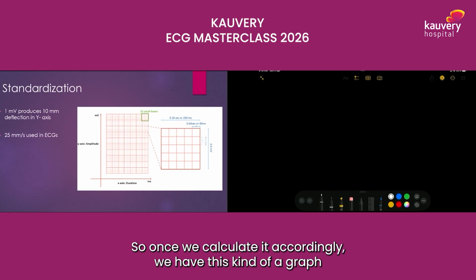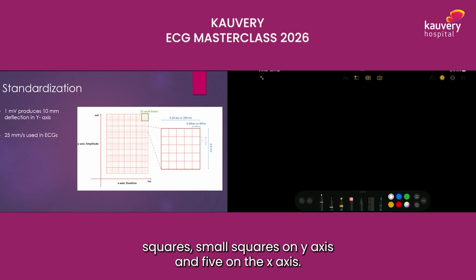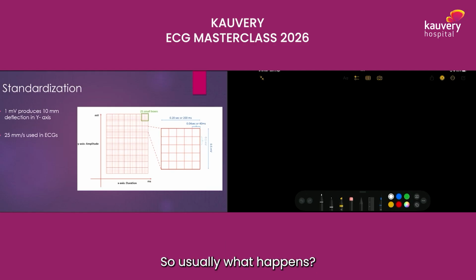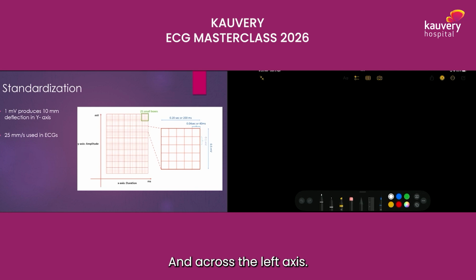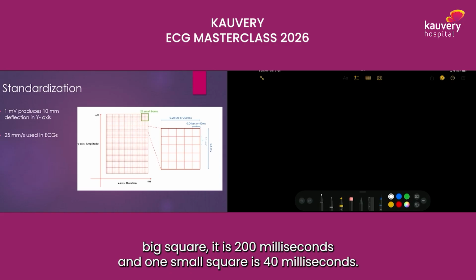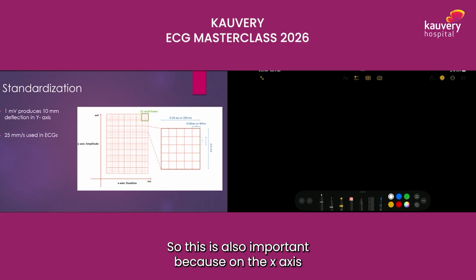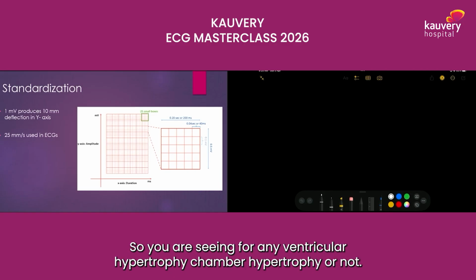Once we calculate it accordingly, we have this kind of graph where you have a large square which contains 5 small squares on the y-axis and 5 on the x-axis. So the 5 small squares represent 0.5 millivolt and 10 small squares represent 1 millivolt. Across the x-axis, when the speed is 25 millimeter per second, 5 small squares, or one big square, is 200 milliseconds and one small square is 40 milliseconds. This is important because on the x-axis you are calculating the rate, and on the y-axis you are seeing the voltage, so you are checking for ventricular or chamber hypertrophy.